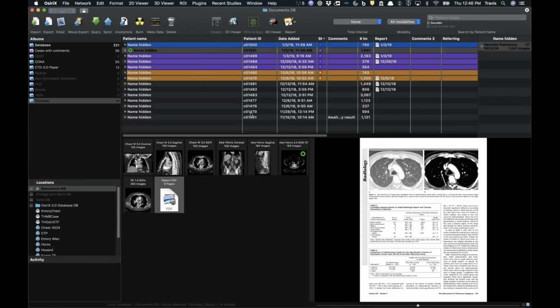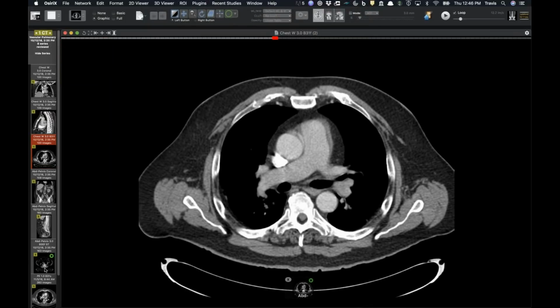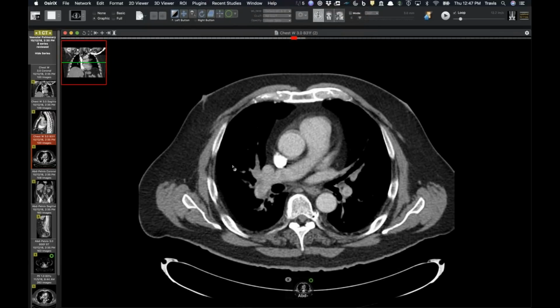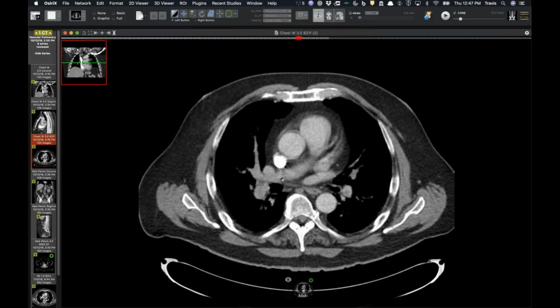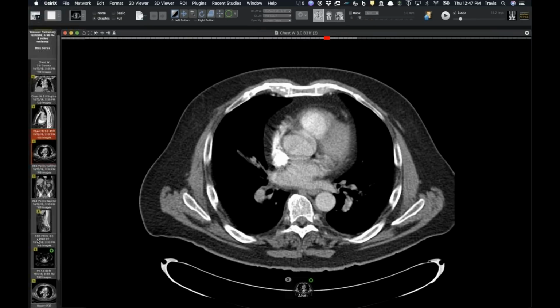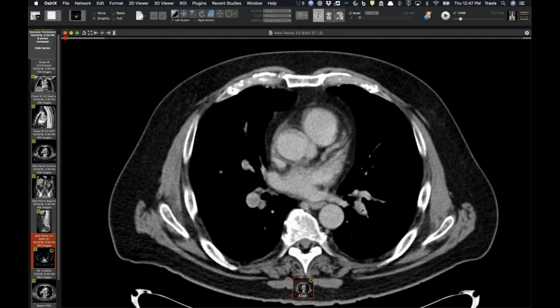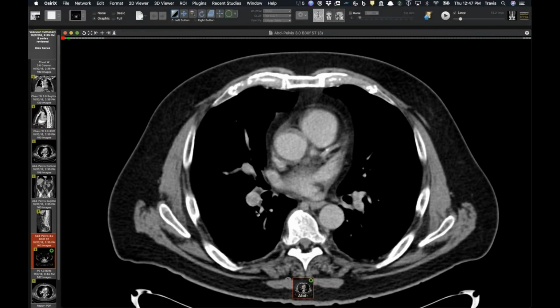But clearly we have an example here where even at just over 100 Hounsfield units, you can see the pulmonary emboli. What's interesting is this was the chest done at the same time as the abdomen and pelvis, and there's a little bit of motion on the chest, where I think nobody would put any significant amount of money on it. But on the abdomen and pelvis done at the same time, you can clearly see that there are lower attenuation filling defects.